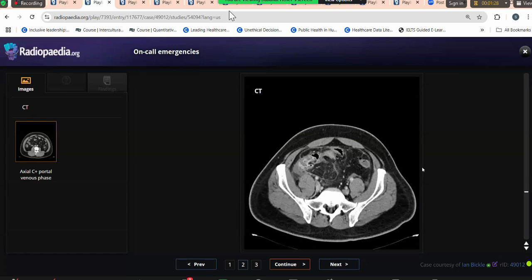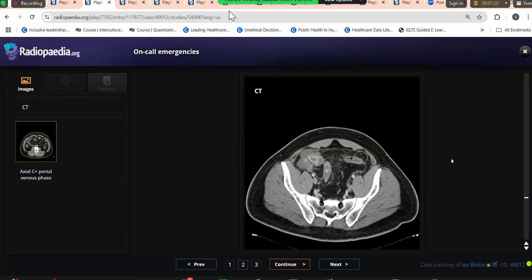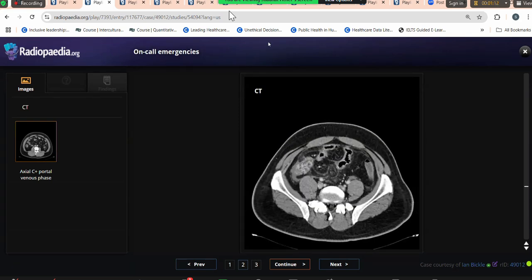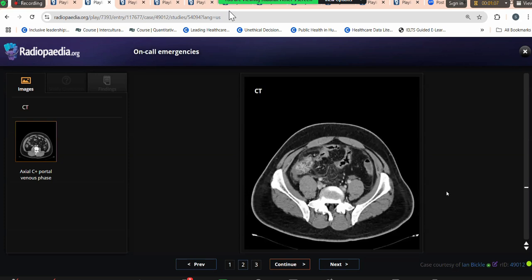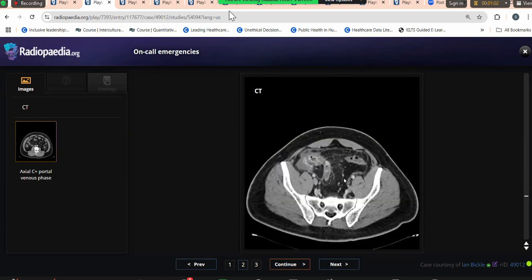So no matter how much pressure the surgical team comes and tells you this is not appendicitis, you stay firm and you say, I have seen the CT abdomen and this is appendicitis. I cannot tell you of anything else. So this was just to recreate those scenarios that there can be cases when it's dubious, where there is appendicular mass or there is right-sided colonic changes, and you're not sure whether this is due to IBD or appendicitis. But in cases like these, when the appendix is clearly visible, plus an appendicolith, you say this is appendicitis radiologically, period. Yeah? Okay.